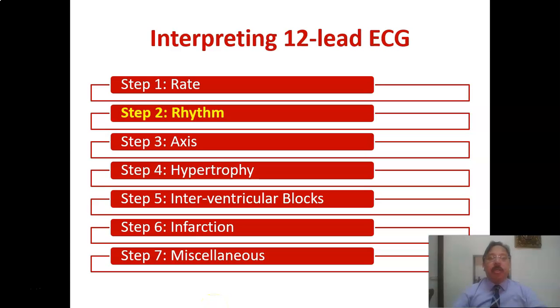We have finished step 1, which was rate determination. Let's start our most important next step, that is step number 2, about rhythm analysis.